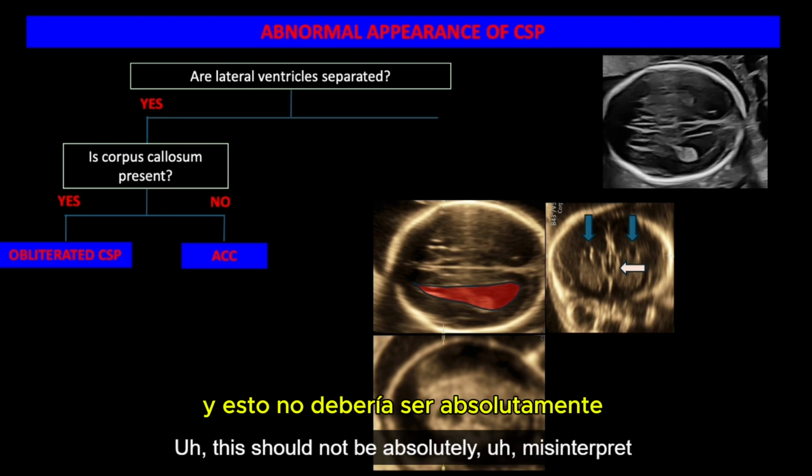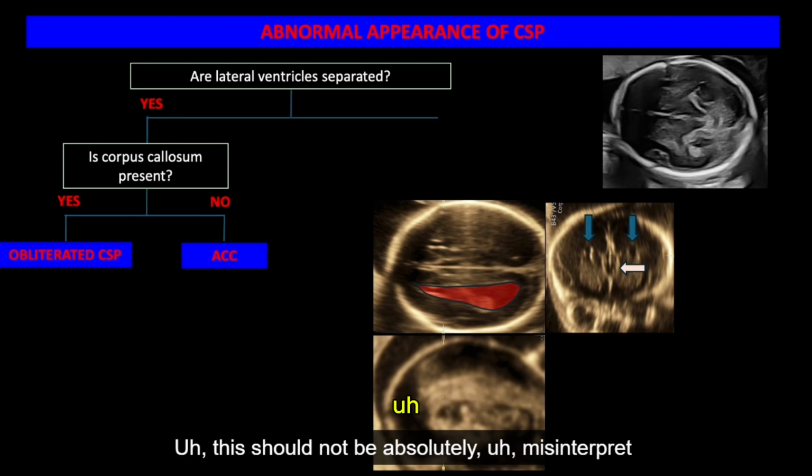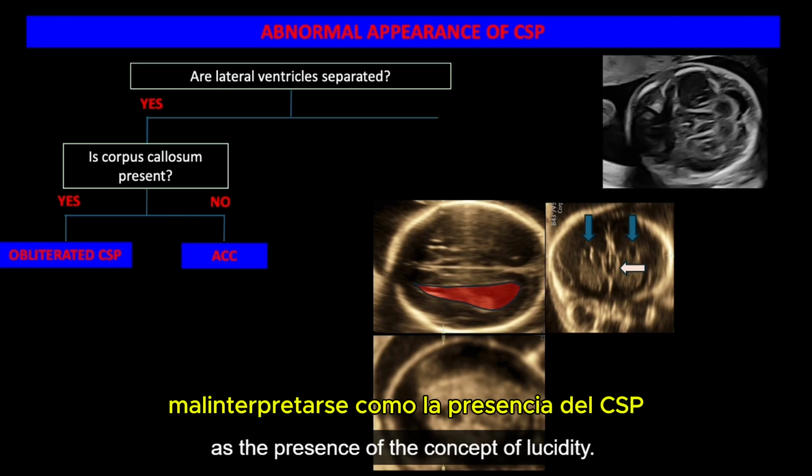This should absolutely not be misinterpreted as the presence of the cavum septum pellucidum.